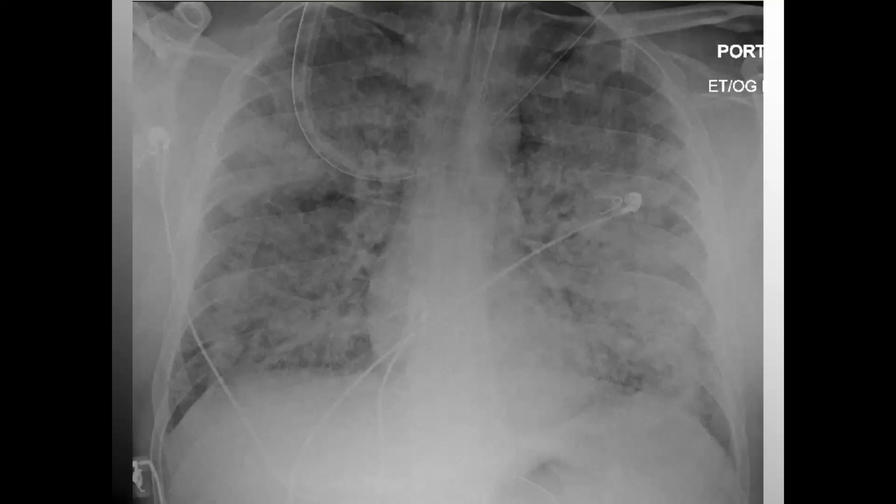E, everything else, we definitely have some catheters and such. Looks to be just your typical ECG electrode leads here. It looks like we've got, yes, the ET tube. If I look closely, probably an NG or OG. I can't see if it's nasal or gastric, and it looks like it goes into the antrum of the stomach. This is probably just some catheter laying across as well. Nothing else really penetrating the body. I don't see a central line, a PICC line, or portocath or anything.